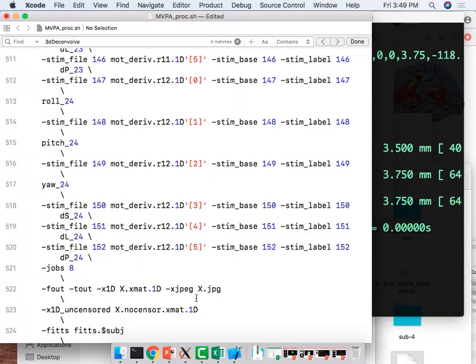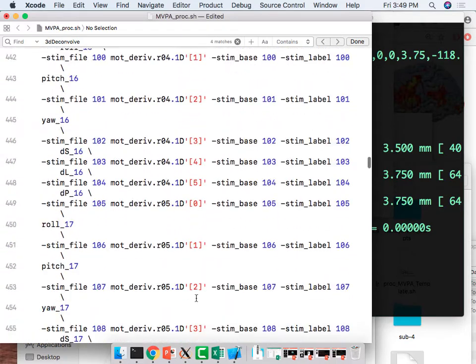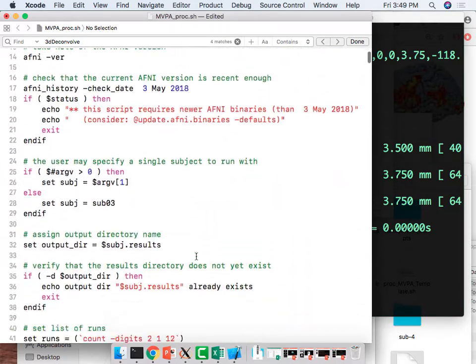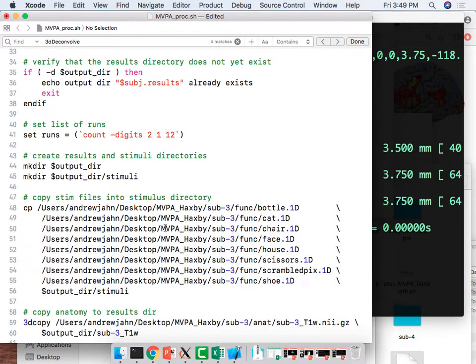If we're not, well, I don't know. Last thing I'm going to change just to make sure you can all use this is to make sure that there are no path issues. So what do I want to do with this? Okay, so we're going to be running this from each. Let's run this from the sub3 directory.